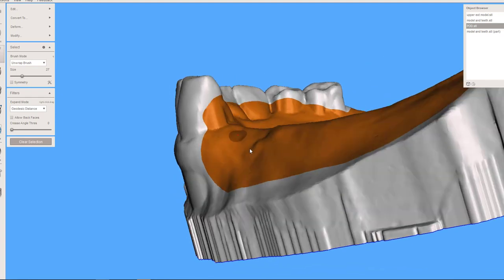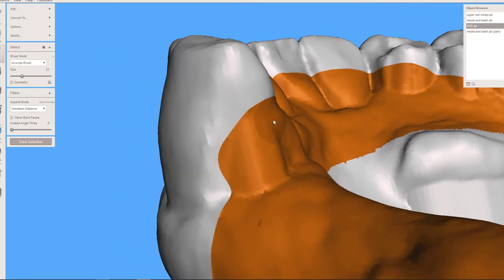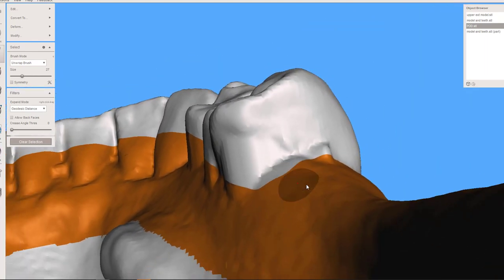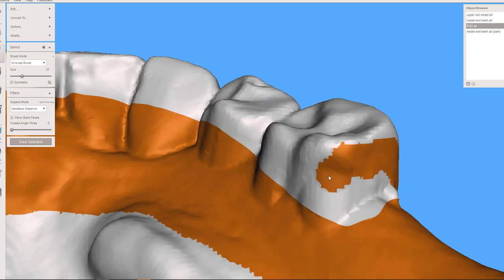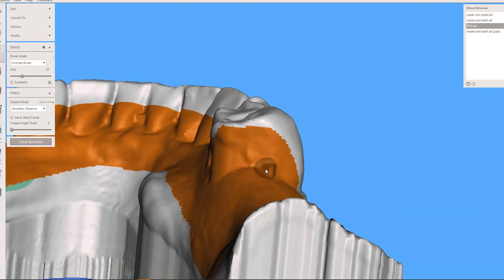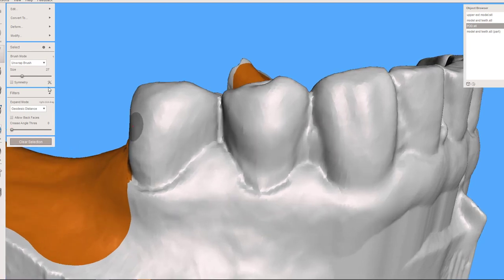All right, that looks good. And I'm thinking about on the distal here, being able to wrap around, have a good plane that it can sit against on this tooth. Need to create that on this tooth as well. Maybe a little too tall up here. There we go. And then I'm thinking about clasps.